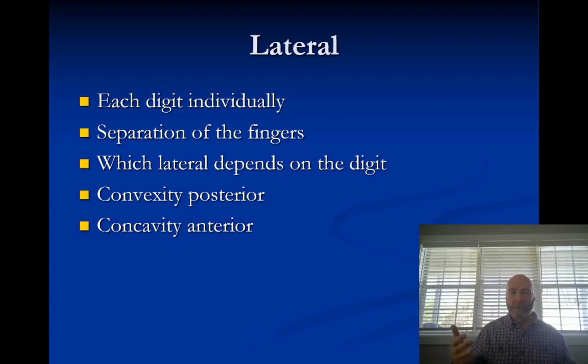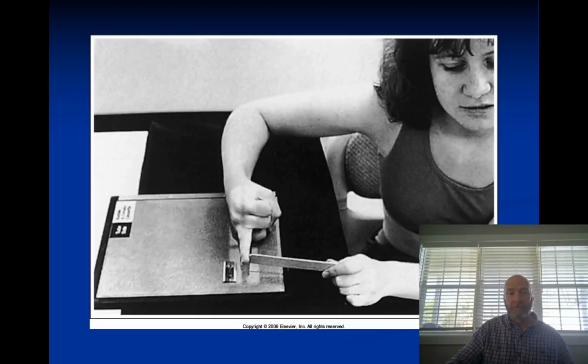And first semester students, you're going to have a tendency to say, okay, well, I'm shooting, let's say, again, the ring finger. So what I need to do is decrease OID, which is the reason that you put the medial side down for the fourth digit. So I've got to reduce OID, I'm going to do that. And you don't want to do that. And the reason for that is because, again, now you're going to close up those joint spaces. You don't want to do that. Even though you're going to have an increase in OID, keep the anatomy parallel to the image receptor. Otherwise, you're going to have distortion. You're going to have foreshortening and closing of those joint spaces.